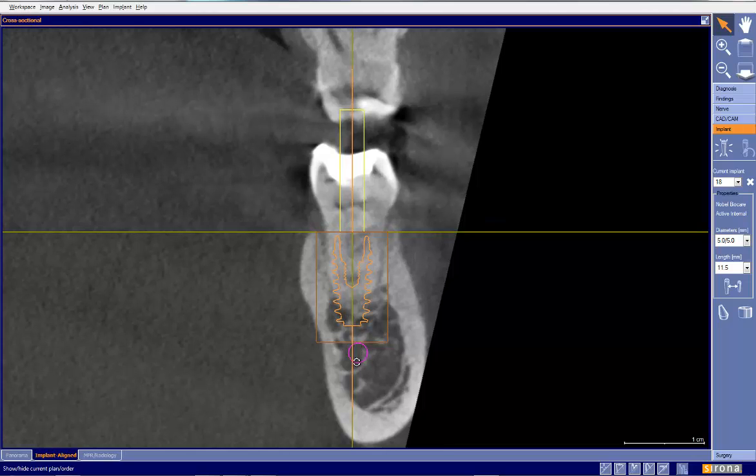Let's take a look at the implant plan itself. I think our nerve is marked pretty closely to be accurate. If anything, we've erred towards being more superior, which is the error I'd want to make. We have 2 millimeters from the nerve. We don't look like we have a lot of stability in this view, but we have to take a look at all views to determine that.